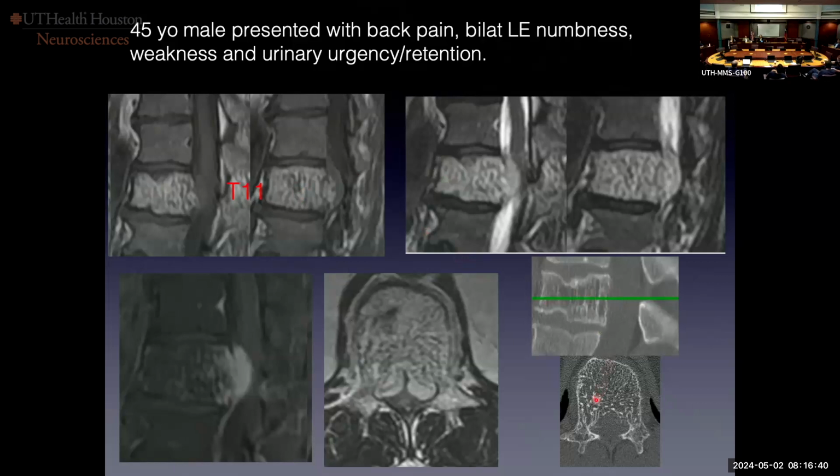So that's clear. His question was about this particular component, which appears to be compressing the spinal cord, but appears to be intradural. He was concerned about that with the dural tail. Was this a collision of some sort? Was this also a meningioma? When you look at the axial post-contrast image, you see this festooning of the dura and the central tethering with the meningovertebral ligament, which defines the anterior epidural space. So this is not anything concerning beyond the fact that it is a hemangioma that has become aggressive, that has extended out of the cortex.